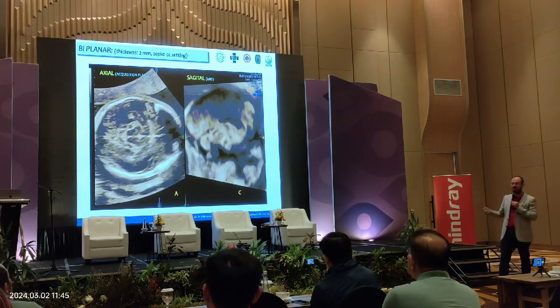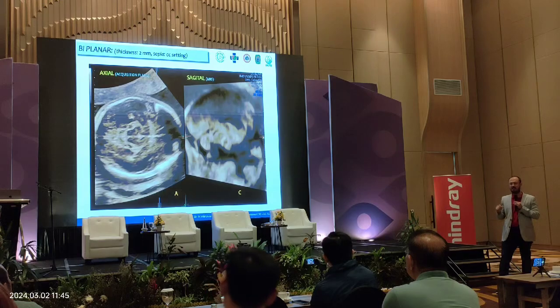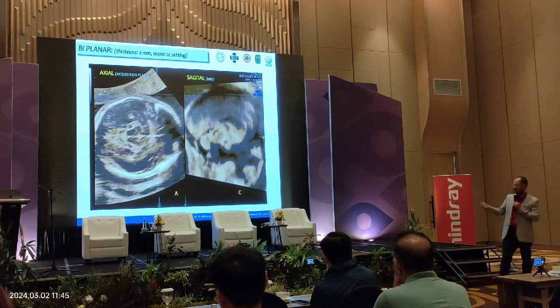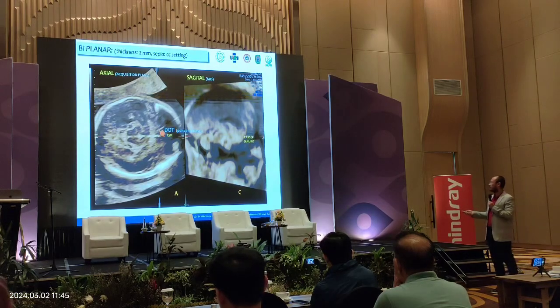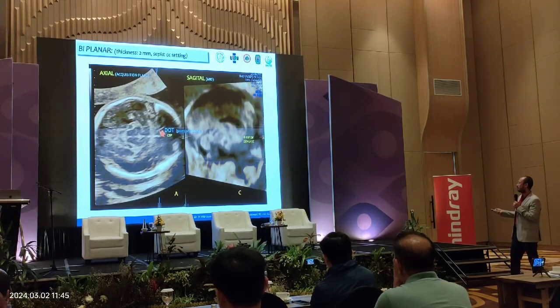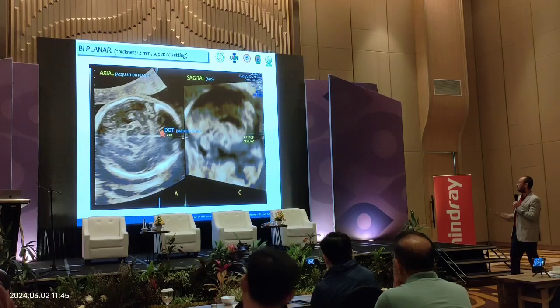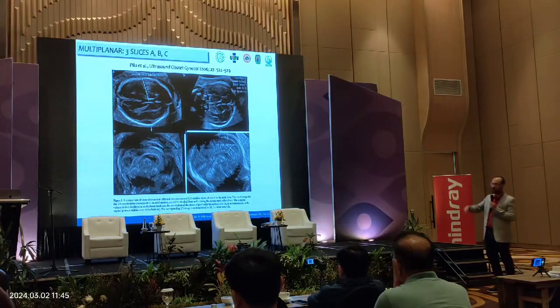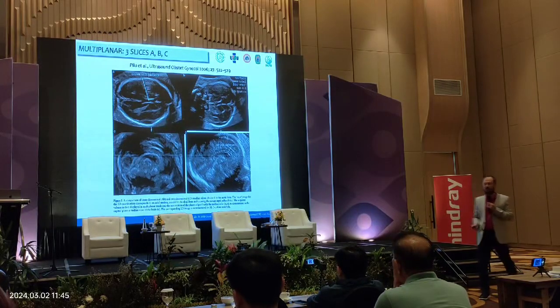Very clear, the vermis, the cerebellum, the body is not disrupted and there is no angulation, like if it is being pushed by the Blake's pouch cyst. Okay? This is the point of interest. If we put here, in the cavum septum pellucidum, we can see the dot come out from the tip of the genu of the corpus callosum, because the corpus callosum is the roof of the cavum septum pellucidum.